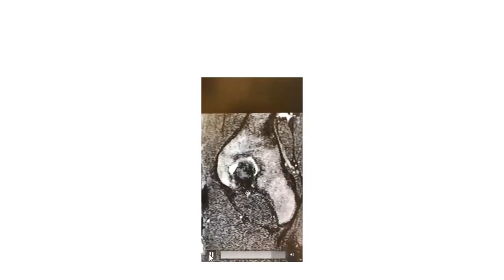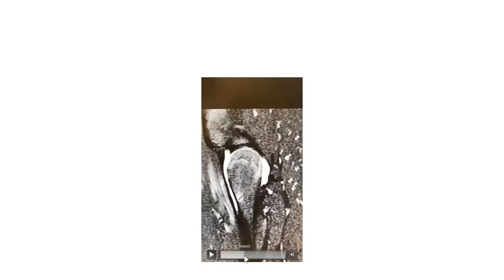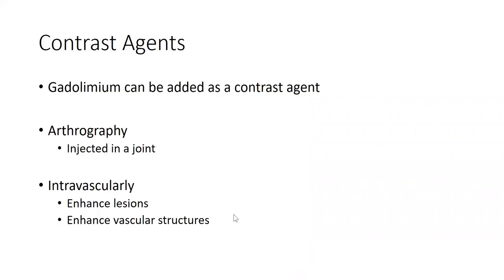So that image was more of a T2 weighted image, okay? And in this one, the bone marrow is white. So why do we still see the fluid inside of the joint there? Sorry, I'm wrong. This is a different T2 weighted image. Where my cursor is highlighting right there, that is edema within the bone. That bone has femoroacetabular impingement, FAI, going on. So that's a bruise taking place right there. So the bone is showing evidence of bruising, and maybe that correlated with this patient's pain. And this patient had surgery to correct this deformity. So it answers a question for us.